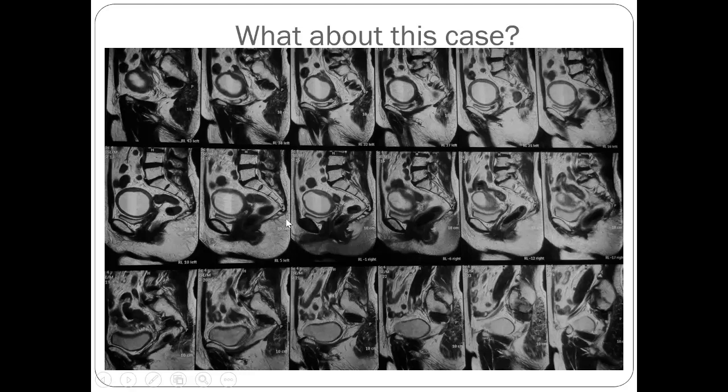Maybe you find it's bright on T1, so it is blood. If it is low on T1, so it is fluid. We term it hydrometra. Hydrometra, why? This is not a young patient. If she were a young female with primary amenorrhea, we would jump to the congenital uterine anomalies with obstructed nature. But this patient was 50 years old. What is the cause? Who can pick the cause here?